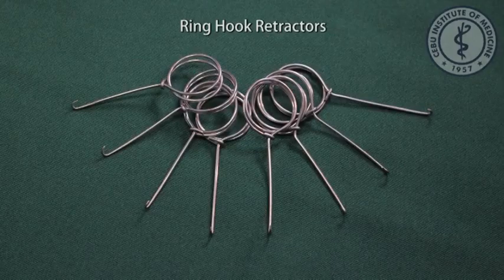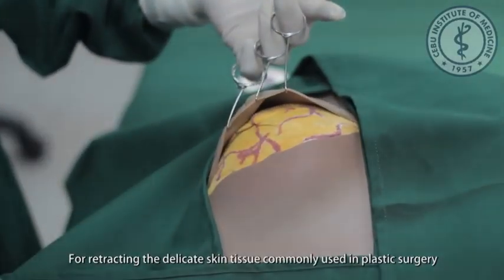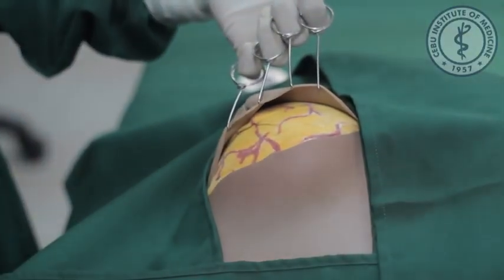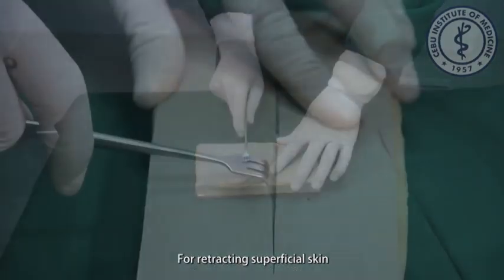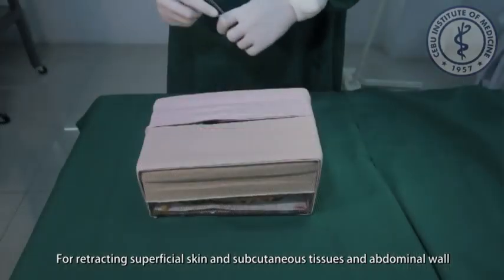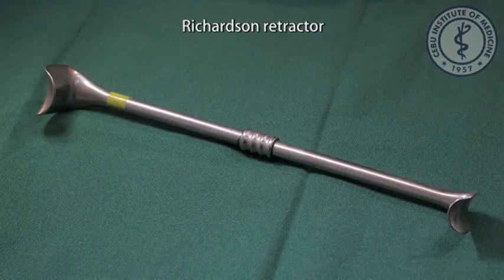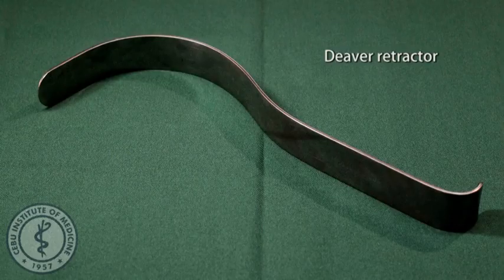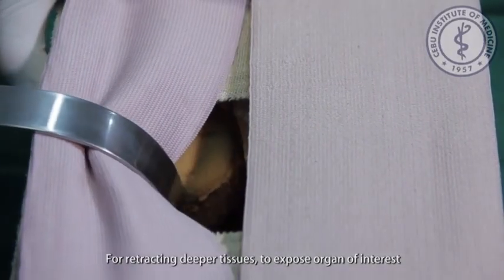Retractors. Ring hook retractors, for retracting delicate skin tissue, commonly used in plastic surgery. Matthews or Senn retractor, for retracting superficial skin. Army-Navy retractor, for retracting superficial skin and subcutaneous tissues and abdominal wall. Richardson retractor, for retracting muscle tissue. Deaver retractor, for retracting deeper tissues to expose the organ of interest.